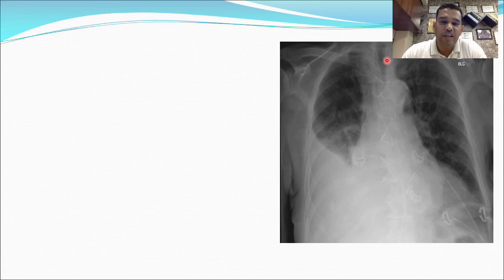This is basically a plain X-ray of chest. You should appreciate the heart shadow and the lung shadow. So we'll start with ABCD. A, you could appreciate the air bronchogram on the right side, but there is some radio opacity over the right lower part of the lung field. So keep this in mind. Whereas the left lung field appears to be normal, you could appreciate the left costophrenic angle. B, bony: you check the right clavicle, left clavicle seems to be okay. Then the ribs seem to be okay to me.